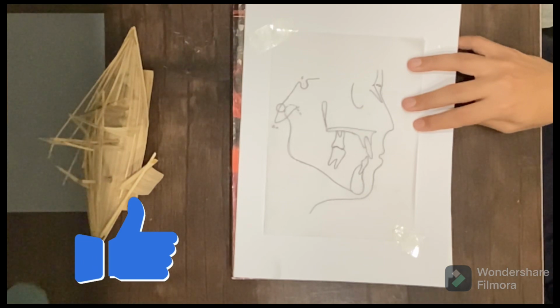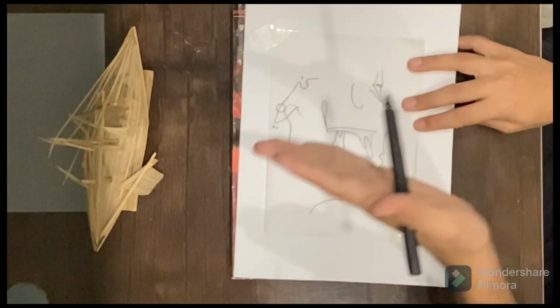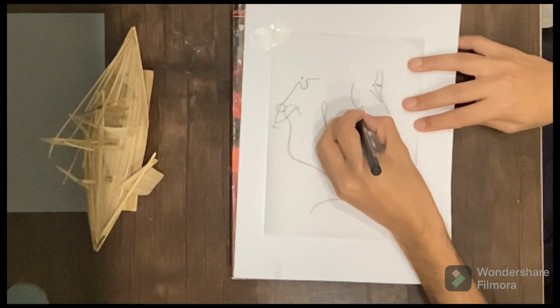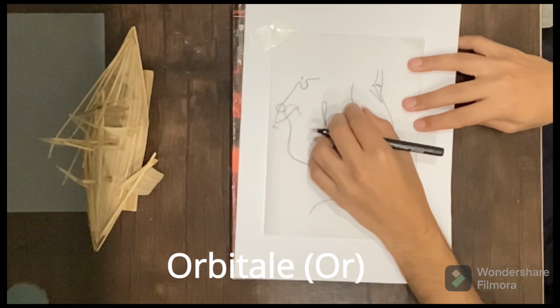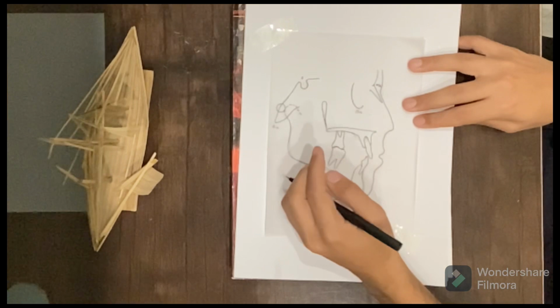Now, coming towards the bilateral points. Bilateral points are present on both the right and left sides of the patient. First of all is the orbitale point. Orbitale is present at the lowest point of the inferior orbital rim of the patient. So it is the orbitale point, which is the OR point.